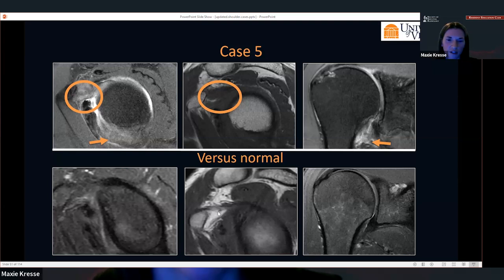Moving to the T1, the normal patient has nice preservation of fat within the rotator interval. You can see the difference in the coracohumeral ligament, how thin it is here versus this patient up here, which is super thick. And you also have a lot more fat in the rotator interval on this normal MRI. And then this one, just showing that edema and thickening versus what it should normally look like, normal suppression of fat in that area.